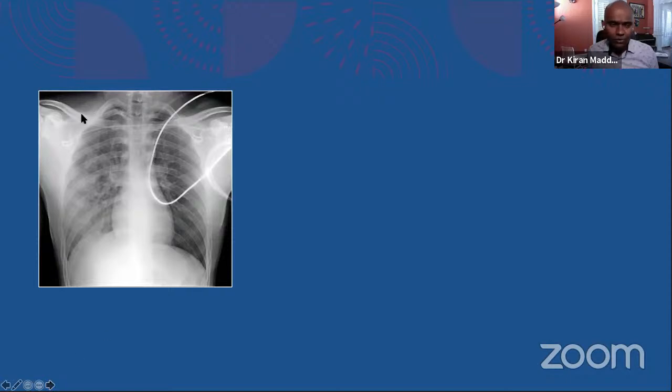Does anybody want to describe the findings on this radiograph verbally, not typing? Does anybody want to talk about this chest radiograph, because I discussed the findings one by one. If anybody is interested to volunteer, what are the chest radiograph findings here? Okay, that's fine. In view of the time, we should better move on.